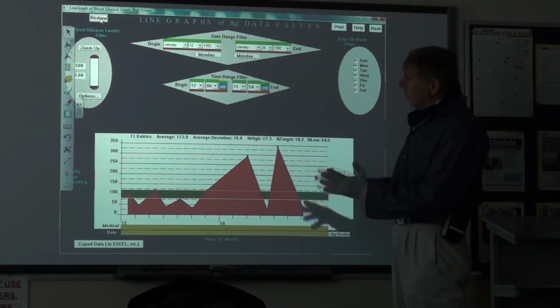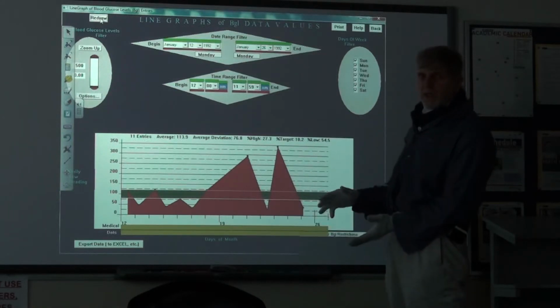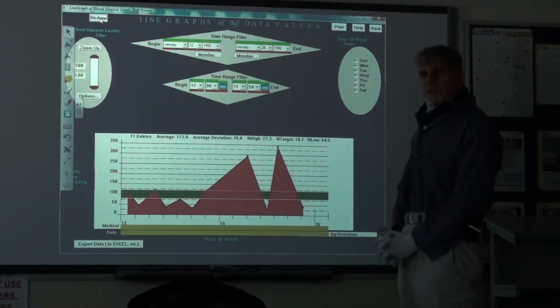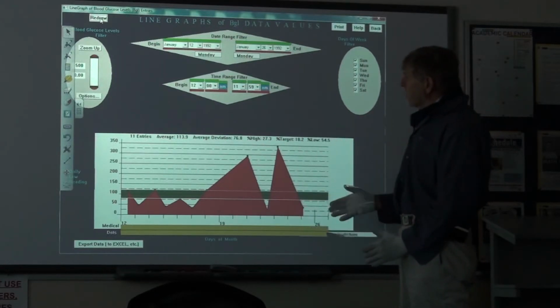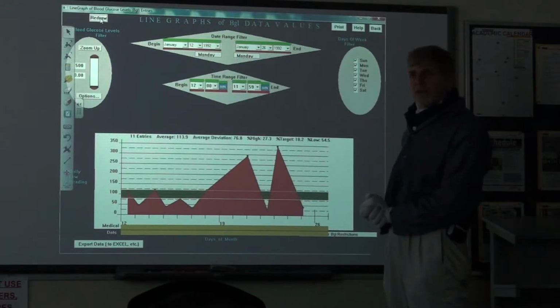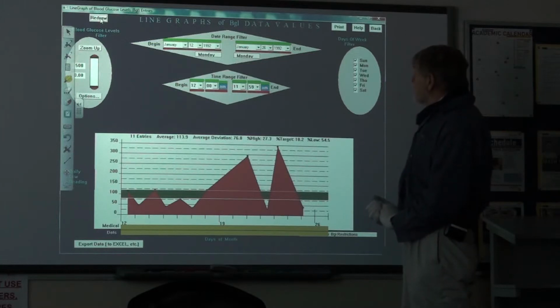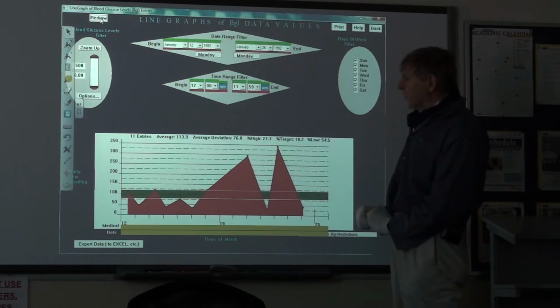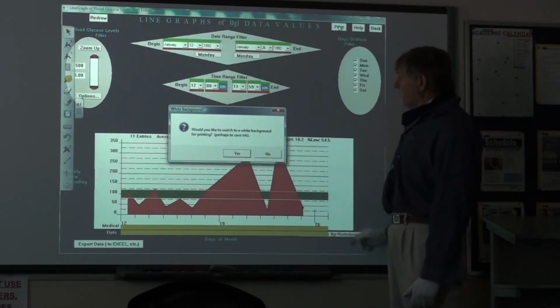So you can do all of these mixing and matchings: time range filters, date range filters, days of the week, high readings, low readings, and also restricting it to certain filtered events or certain filtered numeric values as well. And you can mix those in any combination that you care to, and the more time that you spend with this particular graph on Level, the more combinations that you will come to try until you find the ones that are your own favorites.